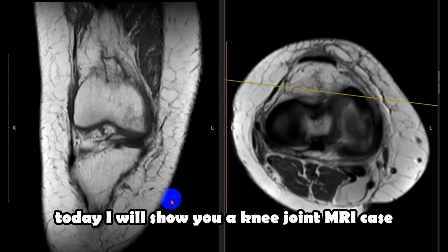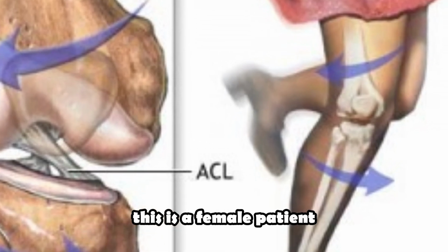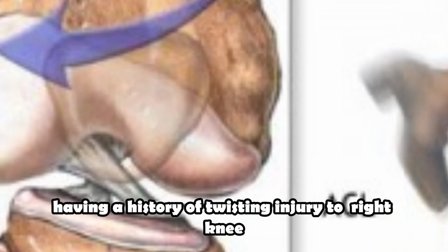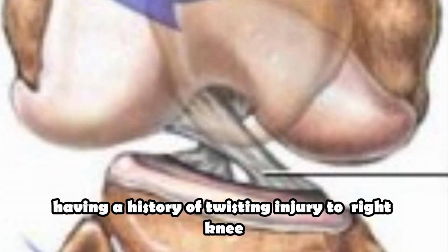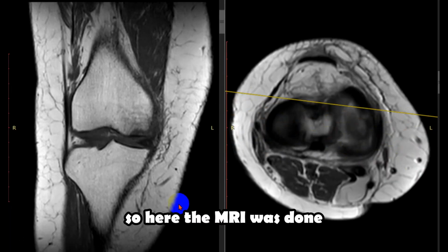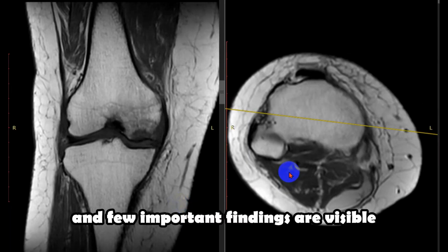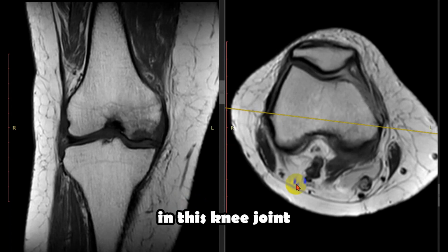Today I will show you a knee joint MRI case. This is a female patient having a history of twisting injury to right knee. So here the MRI was done and few important findings are visible in this knee joint.